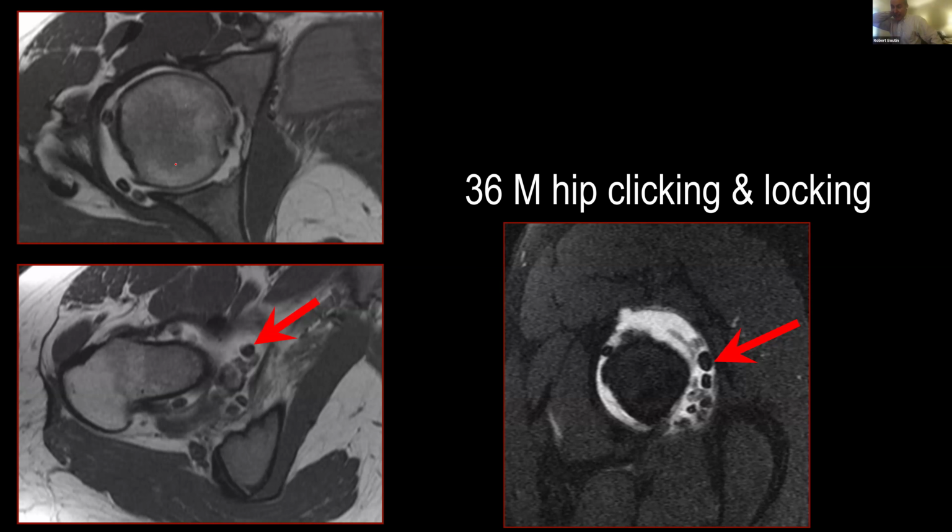I would say that sometimes it's tempting to try and make measurements on an AP hip rather than an AP pelvis, but the measurements for the lateral center edge angle are based on a pelvis radiograph, not a hip radiograph. So I think measurements are potentially a whole lecture series unto their own, but that's my basic take on it.